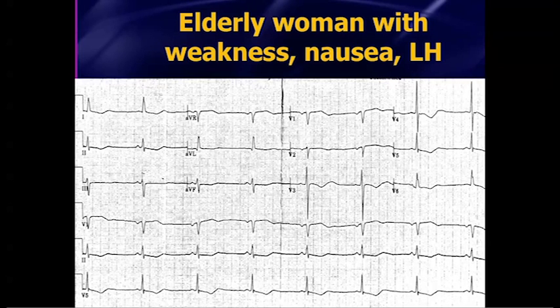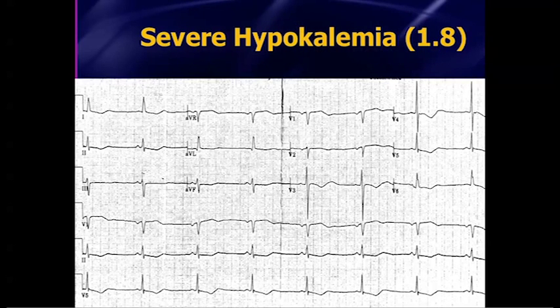This is actually severe hypokalemia. Severe hypokalemia produces these reverse Wellens waves. That's my term. You're not going to see that published anywhere. Hopefully we'll get this published soon. But this is a very, very specific T-wave abnormality for severe hypo-K.